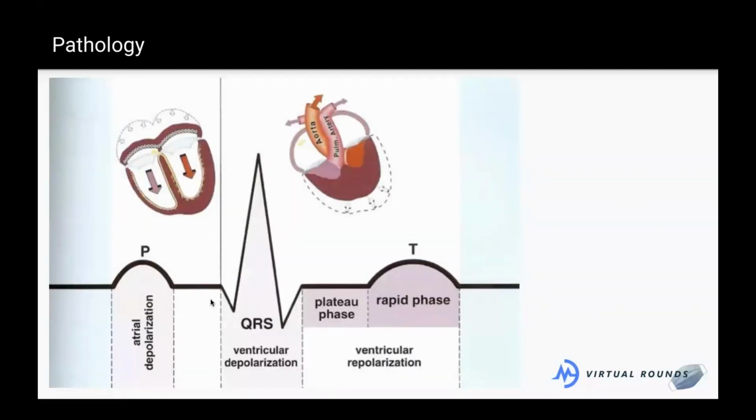Now, what directly precedes the QRS is P, like I mentioned. Remember, the signal comes from up here and down the atria. So that's the atria contracting. It's this little bump. And then it pauses for a second as it travels down to the AV node. And then it surges down each of the ventricles, and it causes the ventricles to boom, contract.